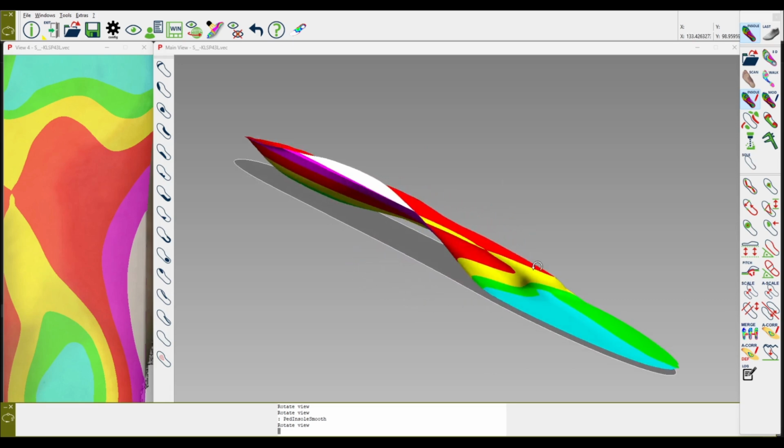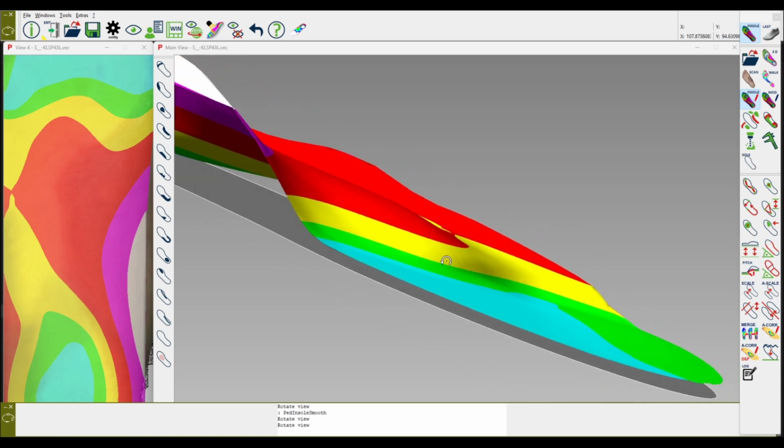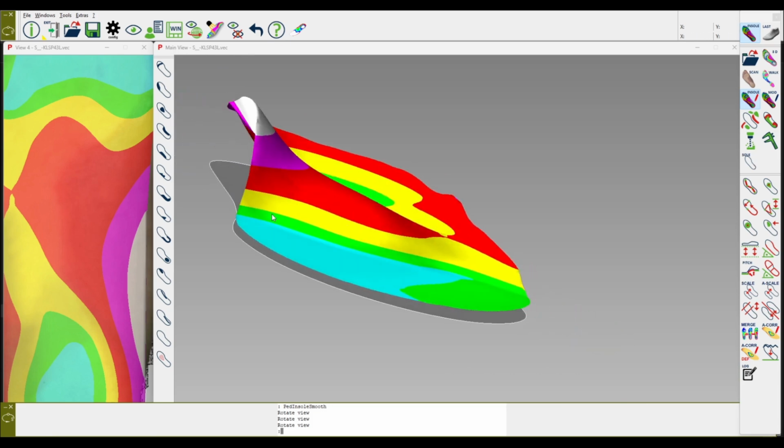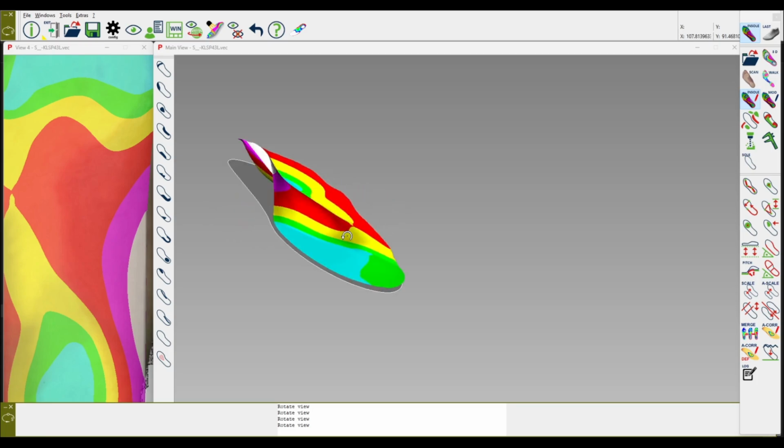And that's basically it. So now we have a nice step from MTP 5 to MTP 2. MTP 1 is as it was before. That's how you can do it.